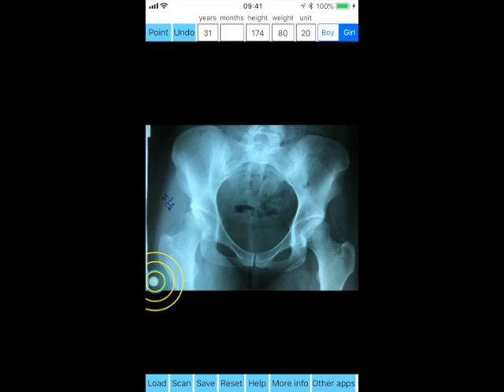Next, a dynamic circle appears with a C1 center point marked over the screen. The radius of the circle is changed dynamically, and by moving the attached finger you try to find the best fit circle to the contour of the coin. Once you found the best fit, you press the point button and the subject, the whole coin, is marked by the circle and the radius point, R2, appears. If the coin, for example, is 10 mm, you enter the number 10 in the unit box.